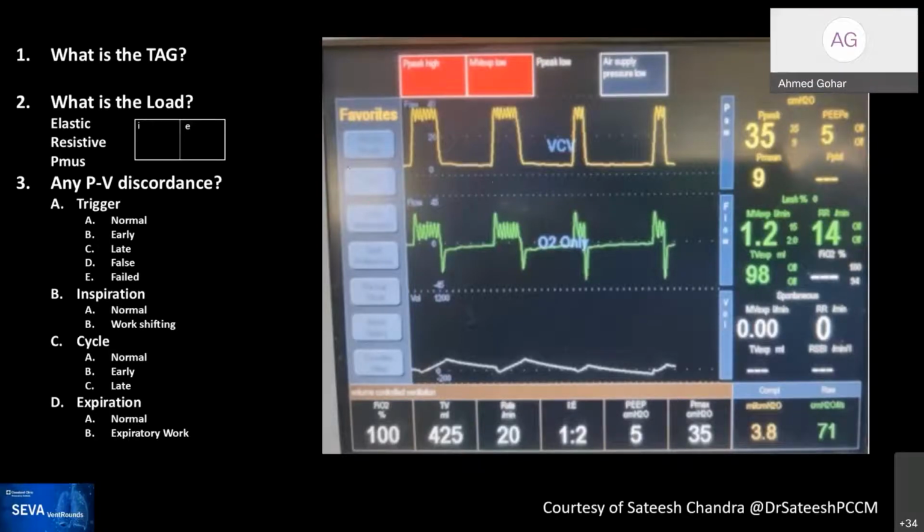Let's see. So, the obvious first thing that I'm going to try and forget about for a while is the very high frequency vibrations in the waveforms. But I'm going to go with the basics. So the pressure waveform, if I neglect that, would look more like a square waveform.